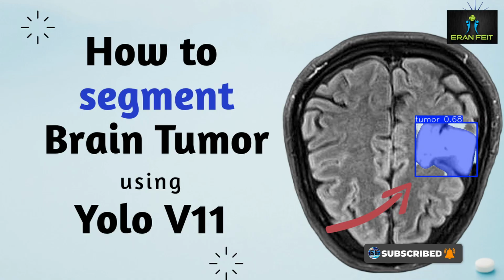And we will divide the prediction process into two steps. One will be more straightforward, and in the second one we will learn how to extract and manipulate the result from the prediction process. This tutorial is part of this segmentation playlist, so you're welcome to watch more tutorials using other tools in order to segment computer vision tasks.